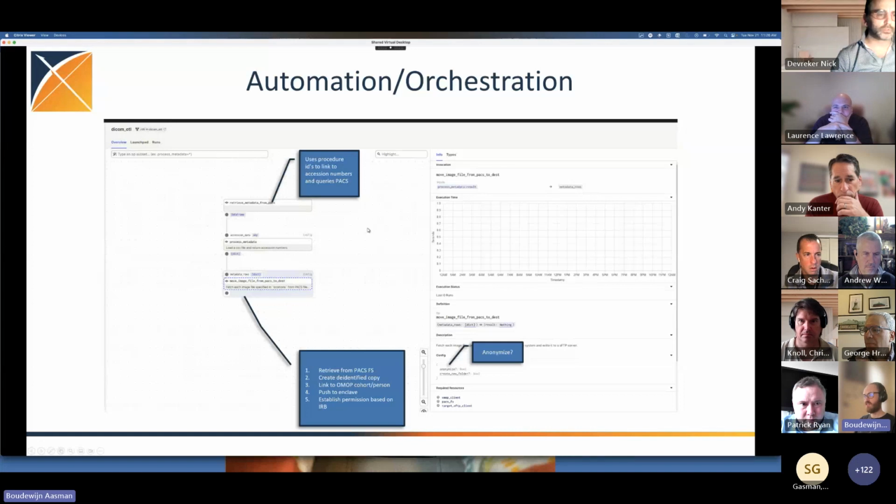we have a lot of different Dagster pipelines in our backend that control a lot of these data pipelines. Dagster is very similar to Airflow, and they're waiting for events on Atlas. And these pipelines are the ones that actually retrieve the information from these external data sources that are not part of the OMOP CDM.